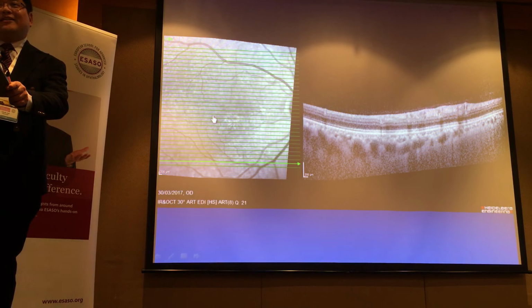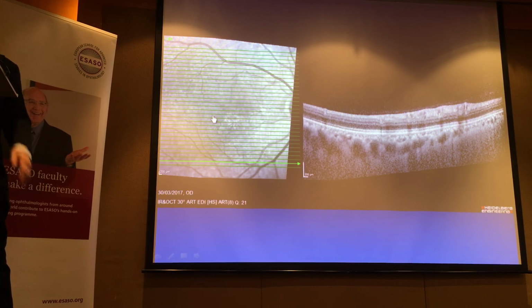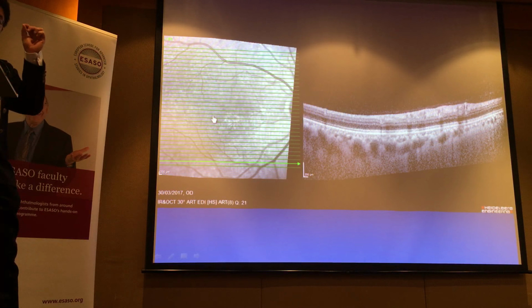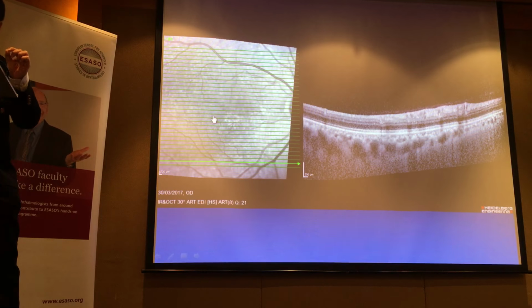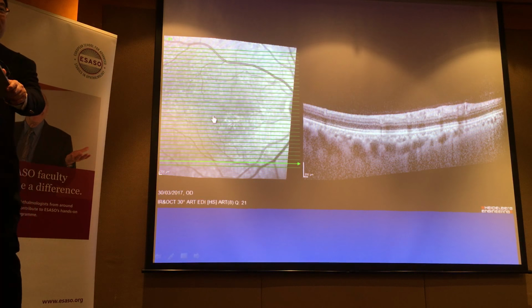Looking at the other scan, that lesion was still there. Just that the difference was this type of scan, and there was one with the finer cuts. It was missed on this, even on follow-up, because there can be slight shifts, but it was seen on the denser cuts, because it's got less space to hide, let's put it that way.